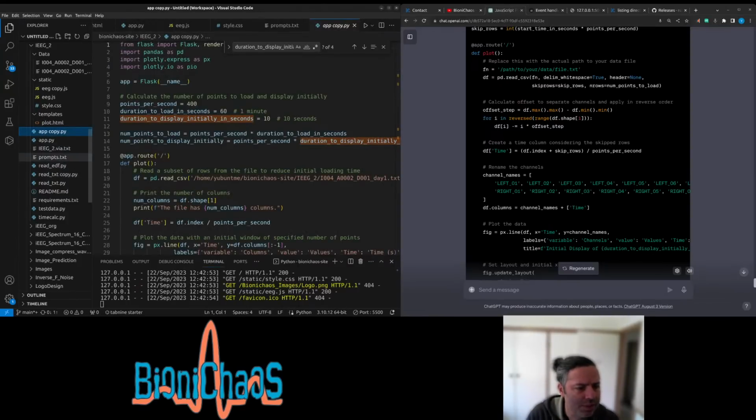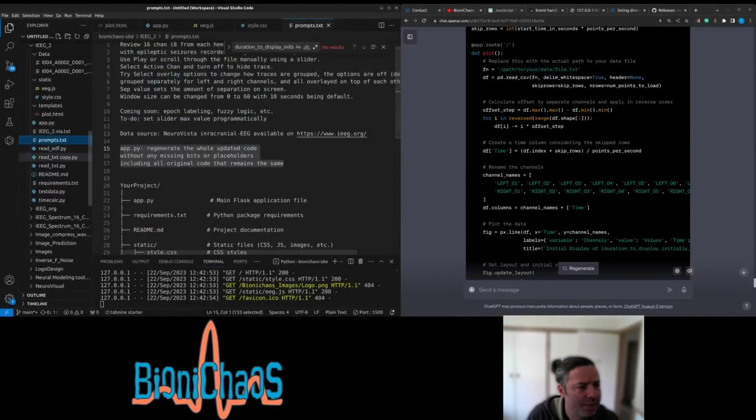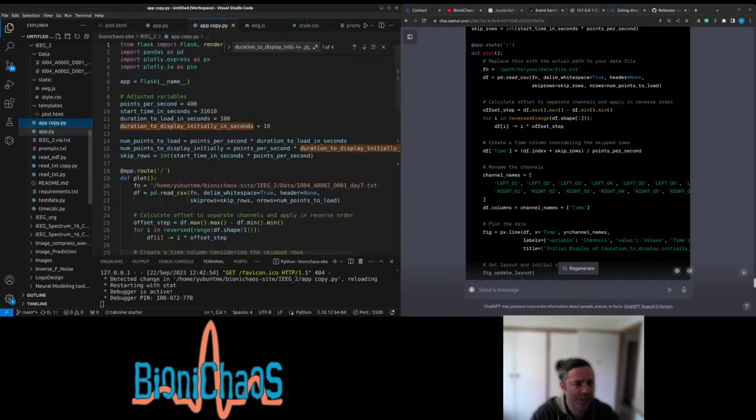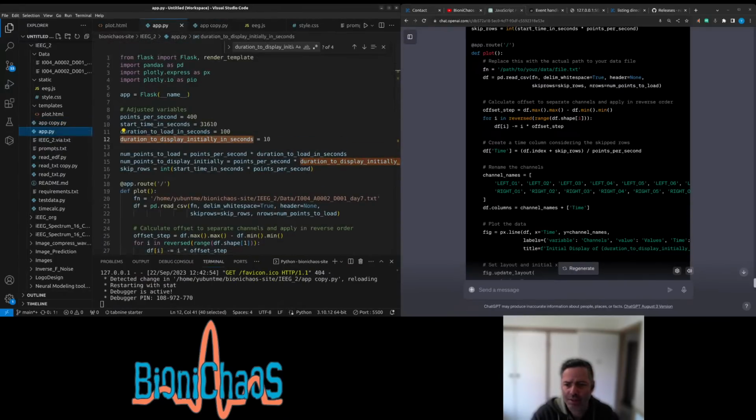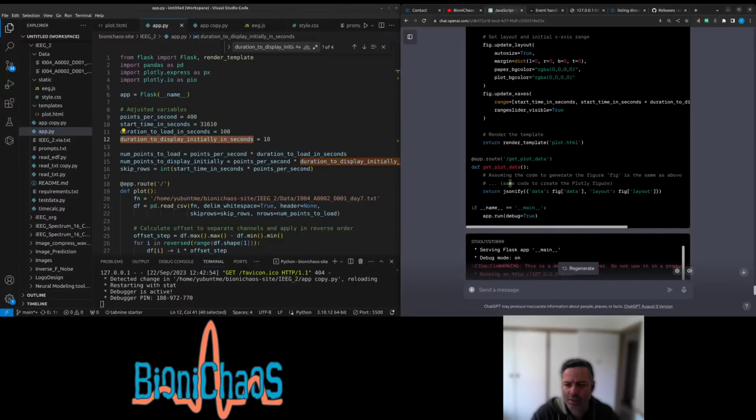Let's delete those copies for a sec. Create a copy of that. Get plot data.